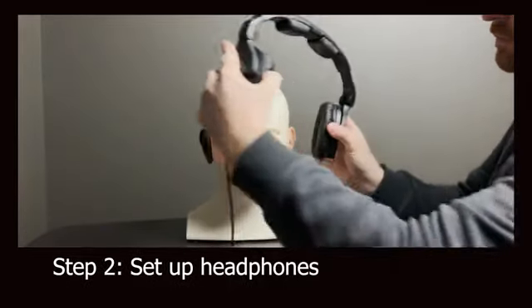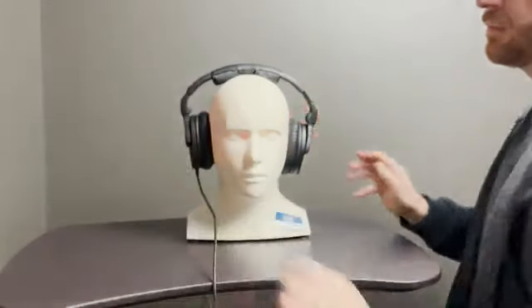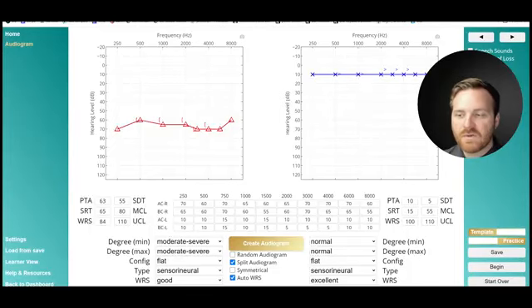Connect headphones to the computer running Theta and place the headphones on CARL. You can use any consumer headphones that connect to your computer. Just make sure that the volume is turned up to at least 50% on your computer and that the audio plays at a moderately loud level.